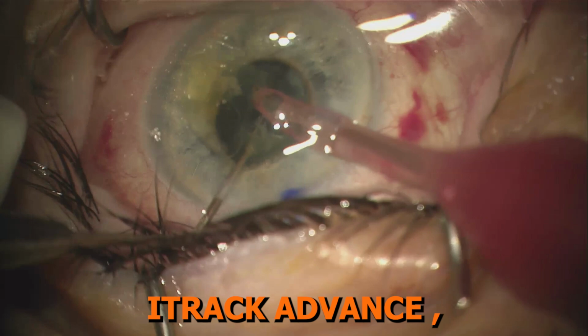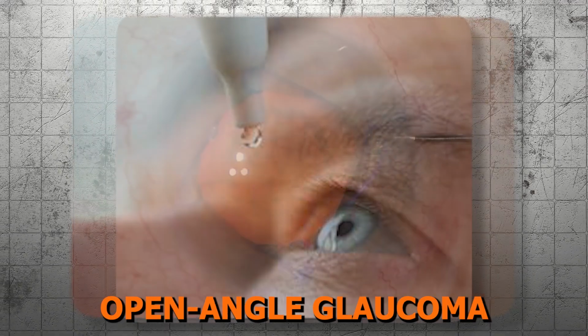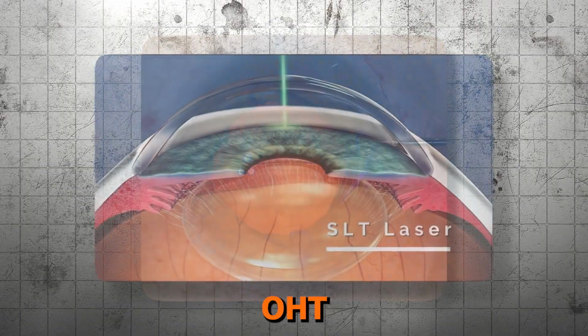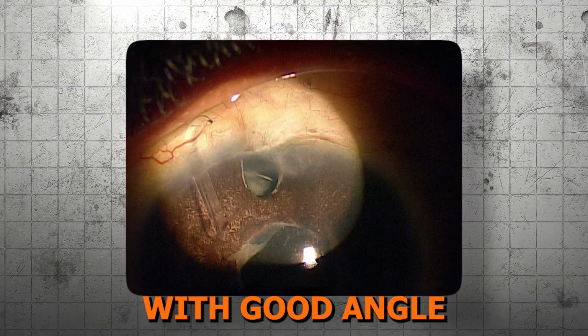Like the iTrack, iTrack Advance is indicated for standalone use or in combination with cataract surgery for mild to moderate open angle glaucoma. It may be suitable for pigmentary or pseudoexfoliation glaucoma, ocular hypertension, post-SLT eyes, and patients with prior failed trabeculectomy or tube shunt with good angle anatomy.